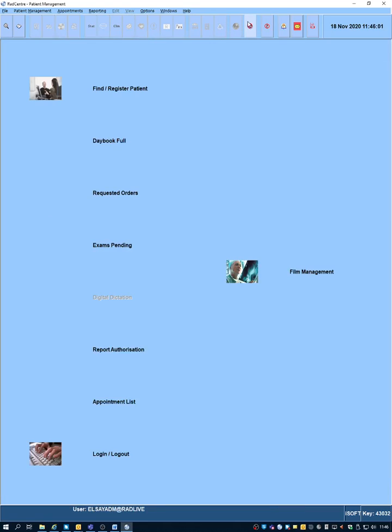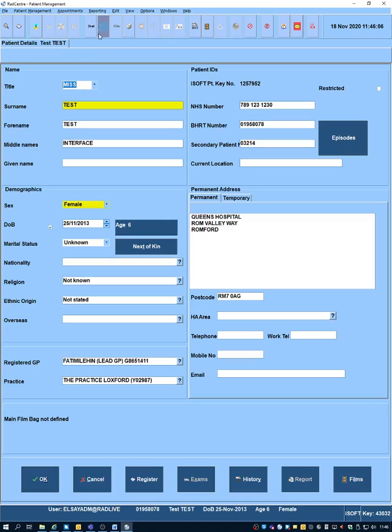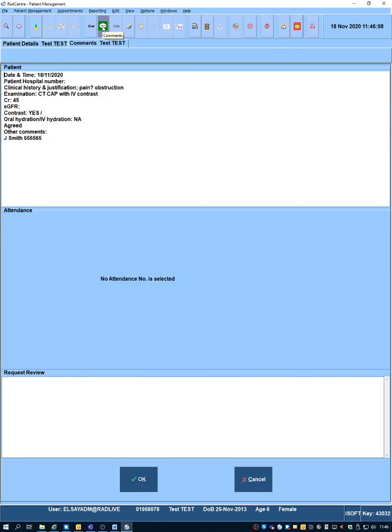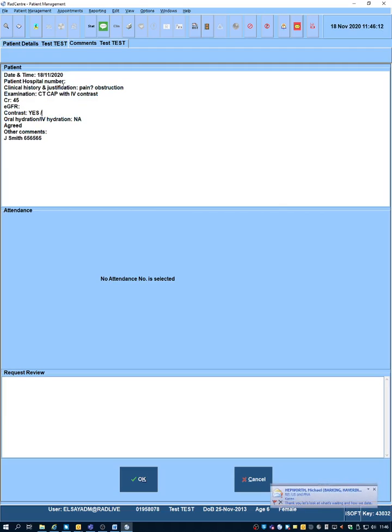Or if you don't want to do this, if you close this patient out and go to the patient again, you could go straight to patient comment and add your comment here straight away. Of course, you could populate many of these messages, for example, one for rejected, one for approval, and all the rest. It's up to you how you want to do it.